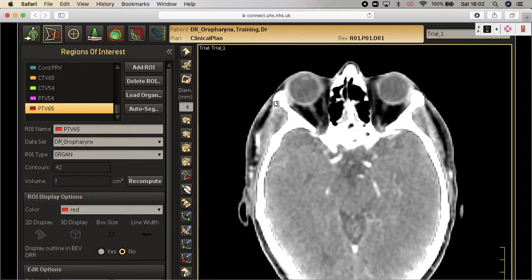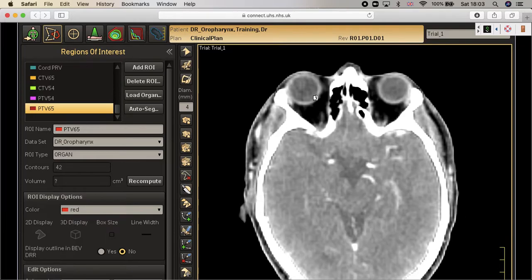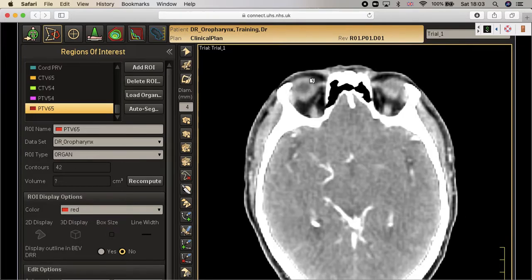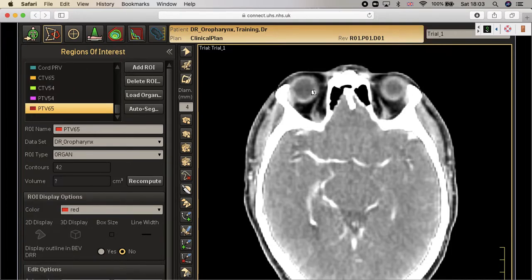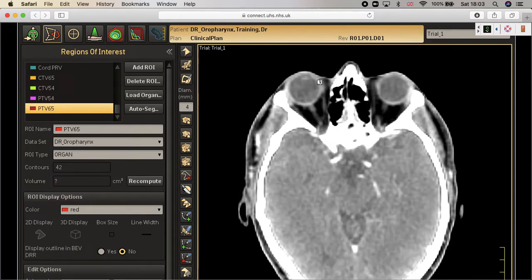Maybe I just want to make sure that when you draw the retina, you take it from the ciliary body or the level of the lens all through, but you don't go anterior. When you go up, you will have to draw the retina all through, covering the underneath of the sclera. So the whole circle will be the retina. I would suggest that you draw the retina in any sinonasal tumor, and be careful while drawing it, because it's very important. Any millimeter can make a difference in a very narrow area like this with ethmoid cancer patients.